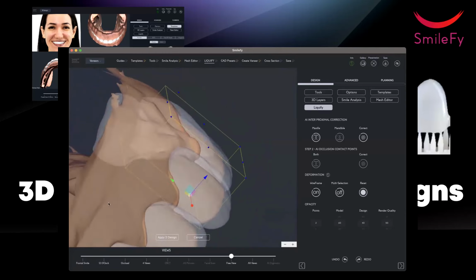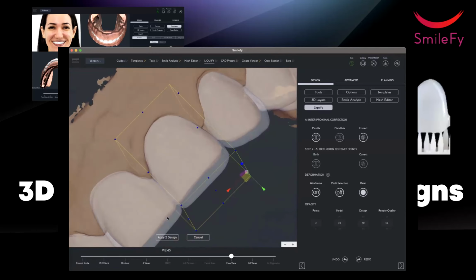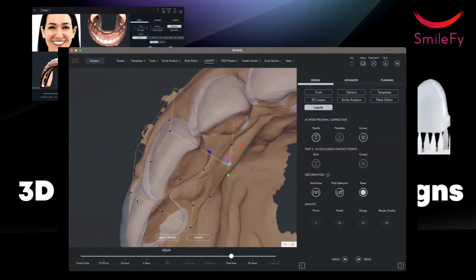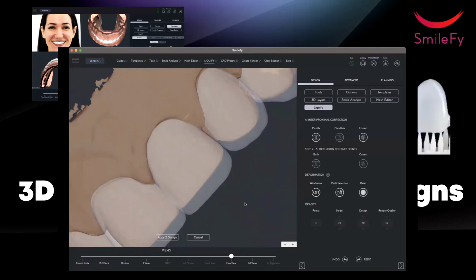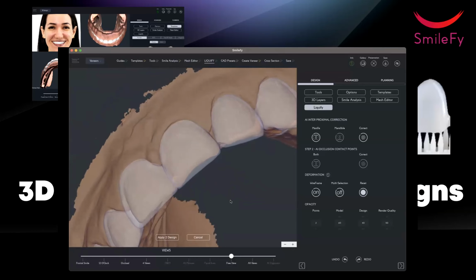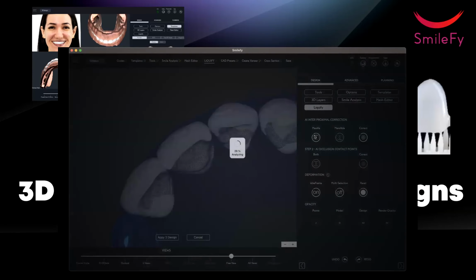With my design. That's one very powerful feature of Liquify. Good. The second feature of Liquify is AI interproximal correction. So do I have a clean interproximal contact in my design? I don't know. So I analyze now, clicking on Maxilla, I analyze. You see now everything is working, analyzing stuff.